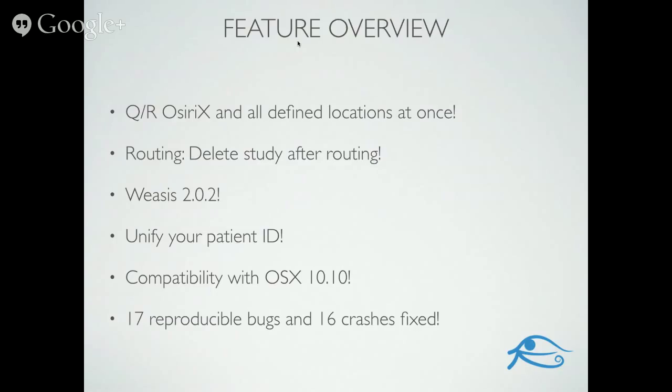You can copy the metadata from your server over to your study that you've imported seamlessly. Something we won't demonstrate, but is certainly worth mentioning: compatibility with OS 10.10 and a number of bugs and crashes that have been addressed.